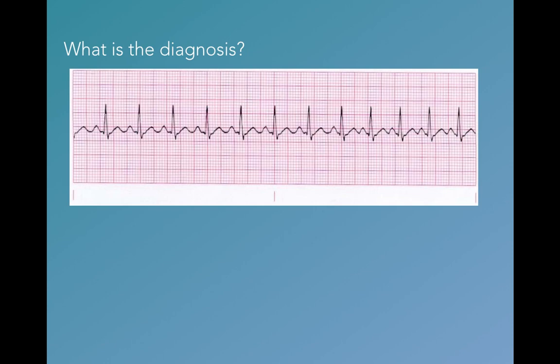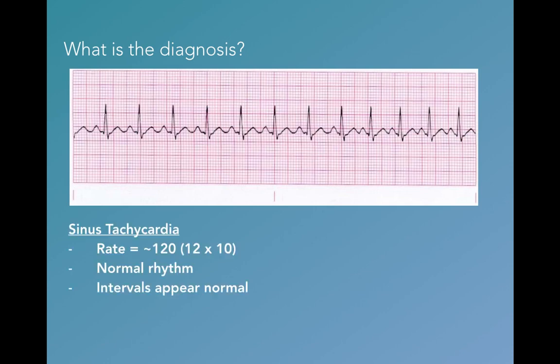From one to the next is 3 seconds. So this is showing a total of 6 seconds because you see the 3 tick marks. So if you count all of the QRS complexes and multiply that by 10, you're going to get the rate. And this is important if someone has AFib or some type of irregular rhythm. If the EKG happens to have these tick marks, then you can just count them up and multiply by 10. And I did that for you.